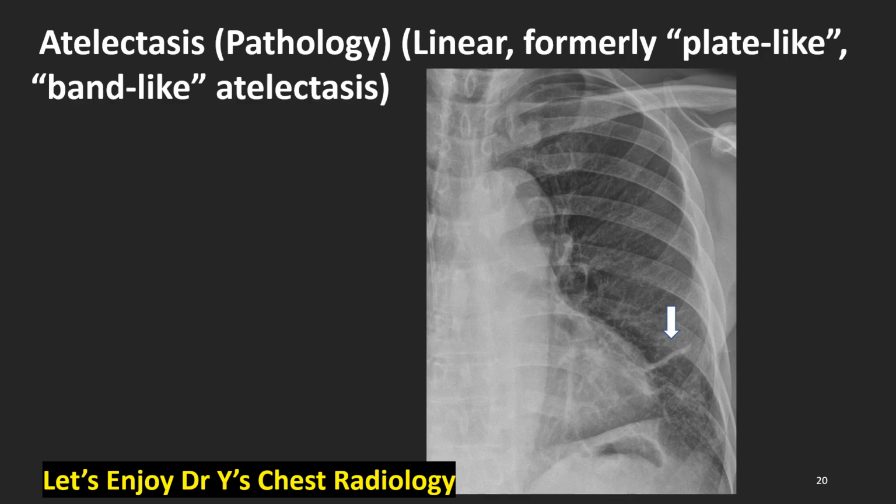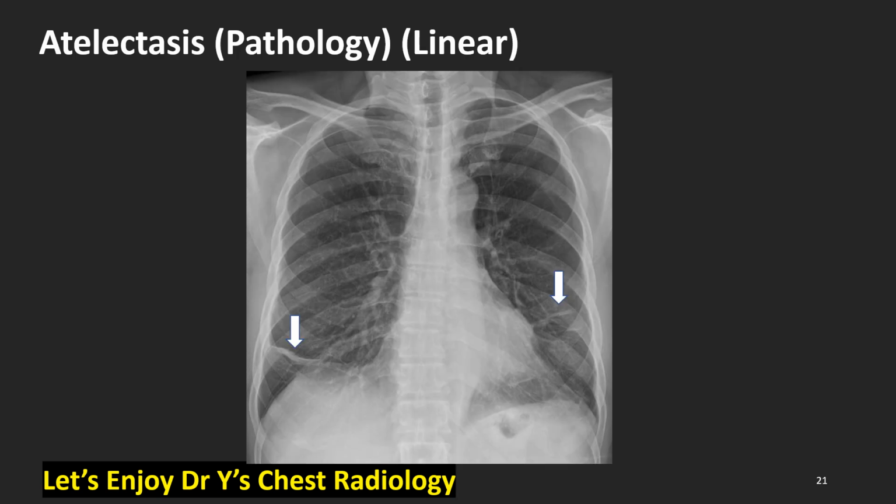Atelectasis pathology, linear, formerly plate-like, band-like atelectasis. Arrow indicates linear atelectasis. Atelectasis pathology, linear. Both arrows indicate both lower lobe linear atelectasis.